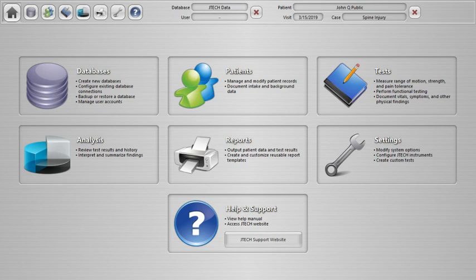Menus in this case have been rearranged. So in some of our previous software, you might know that when you open the program, there wasn't much to look at. But here in Northstar, we've tried to highlight our main functions right here on the main screen. And we're going to talk just a little bit about those just to begin with.